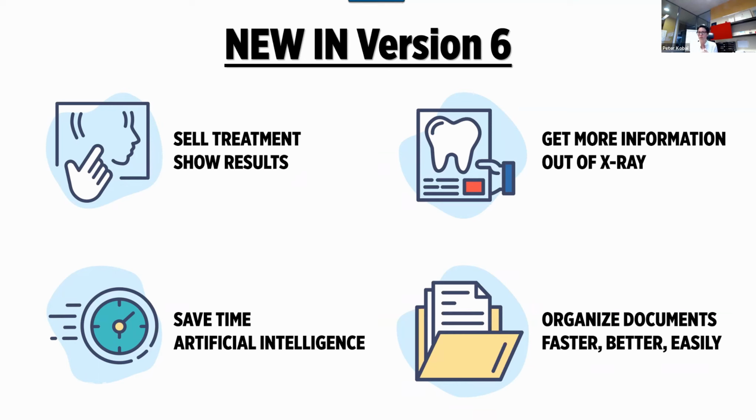Also, with your x-rays, you can turn your x-rays into information. And when we say that, we're not only talking about cephalometric analysis, but you can get results from downstream applications such as skull growth, superimpositions, VTOs. All those are right there at your hand. Of course, again, like I mentioned at the beginning, artificial intelligence. AudaxCeph is a major time saver because artificial intelligence does the work for you, with automatic tracing, where it finds the hard and soft tissue landmarks in a couple of seconds for you. And again, why would you sit in front of the computer and do manual tracings when there is a tool in your software that does it for you automatically?